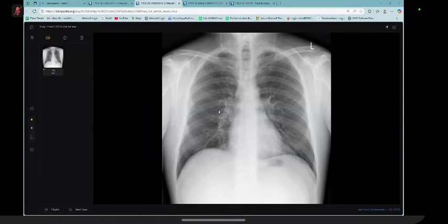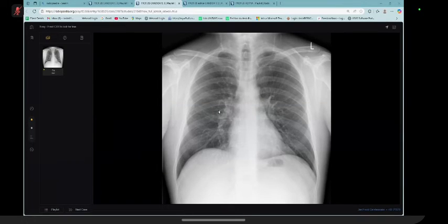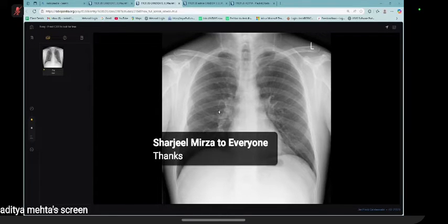Okay. I've been provided with a frontal radiograph of a skeletally mature patient. I will have a look at the chest X-ray. This patient is coming with non-specific abdominal pain. I couldn't see anything clear in the X-ray. I will check the parenchyma. I can see that both parenchyma and both hila appear normal.